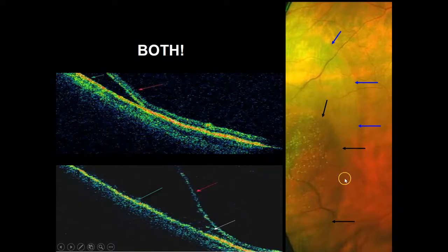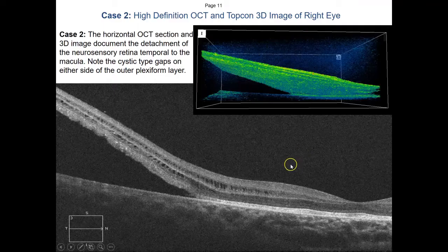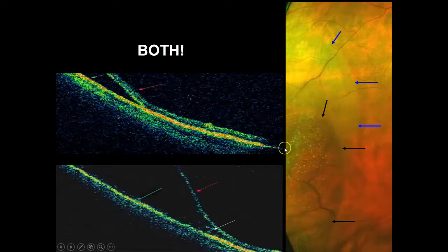Below down here, we have something different. The retina itself looks thinner below, because it is thinner. And as you can see, it looks like it's being torn apart. The one below is actually a retinal schisis. So this is a retinal schisis below, with some little white spots on the surface, which relate to some degeneration of the inner part of the retina. And above we actually have a retinal detachment. So this patient probably had a retinal schisis leading to retinal detachment. And of interest, this patient also doesn't have to be treated.